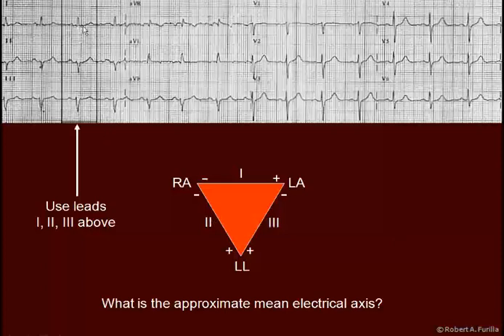We're seeing lead 1, lead 2, lead 3 over here, AVR, AVL, AVF, and V1 through V6. So focusing on just the three-lead Einthoven triangle, we have lead 1 upwardly deflecting, shorter than lead 3, lead 2 downwardly deflecting, and about the same size as lead 1, possibly, arguably a teeny bit taller, and lead 3 being the tallest one, but also downwardly deflecting.